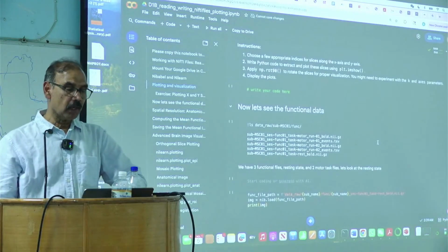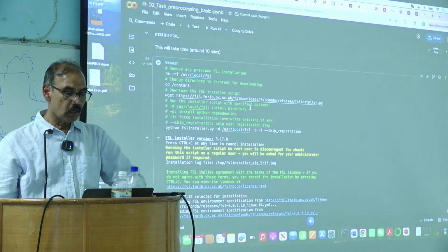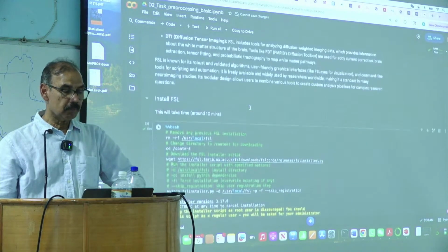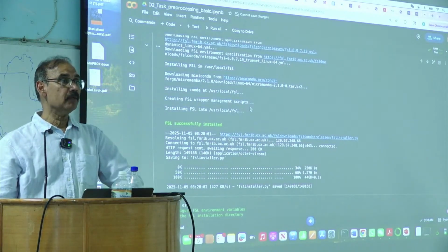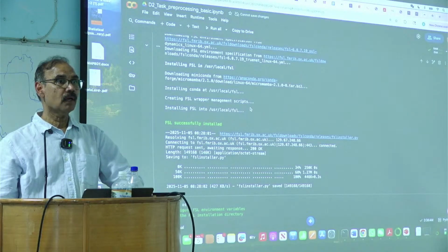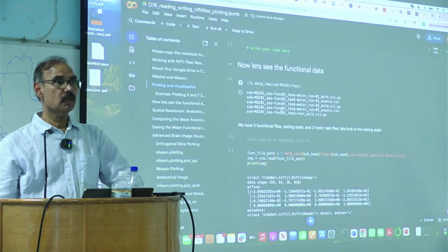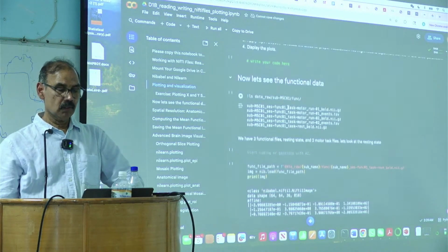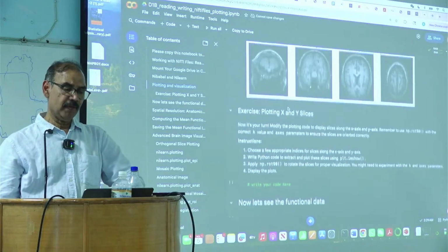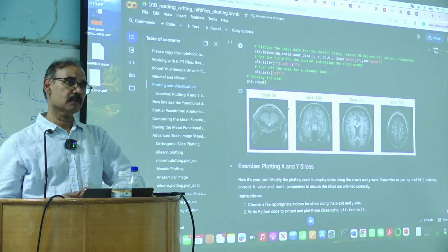So now, let me see. What happened? It is the way it's displayed, but you can change for other values.